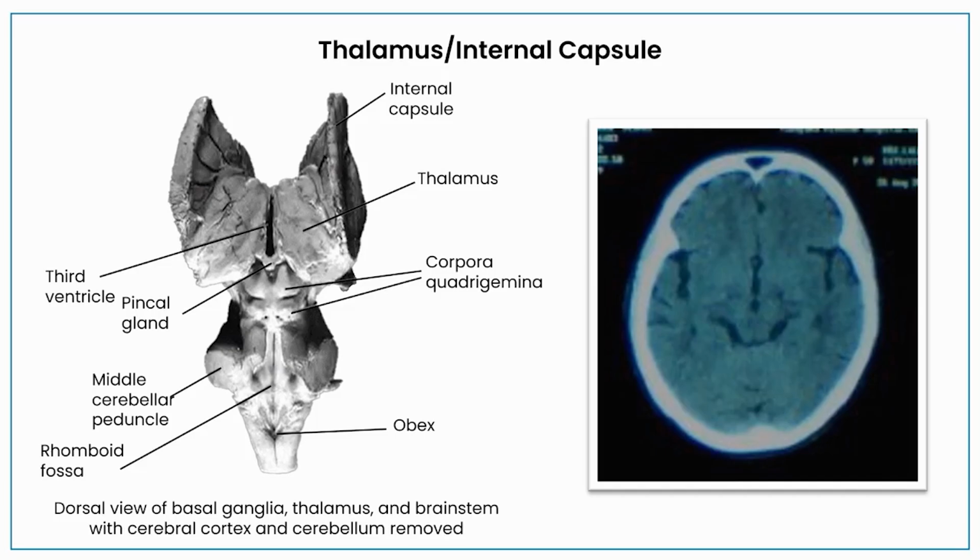It has middle cerebellar peduncles, a horseshoe shaped structure. That will look like a horseshoe shaped structure in the CT scan image itself. Once you identify pons, you know where is medulla, where is midbrain. Above midbrain comes corpora quadrigemina or quadrigeminal cistern, but we didn't cover quadrigeminal cistern yet.